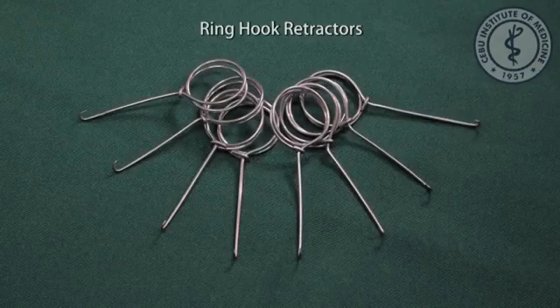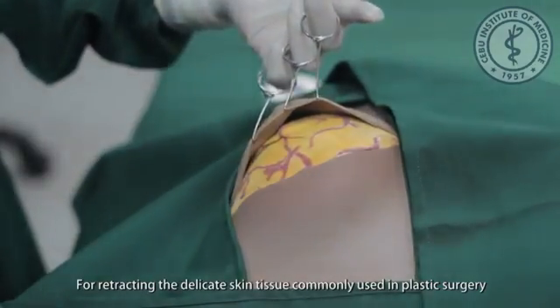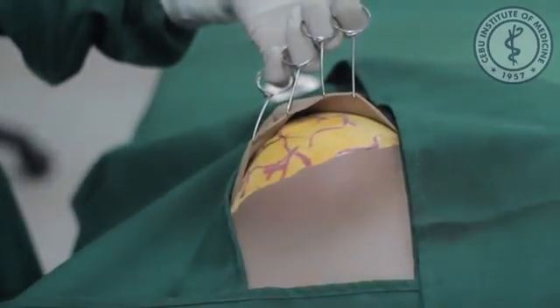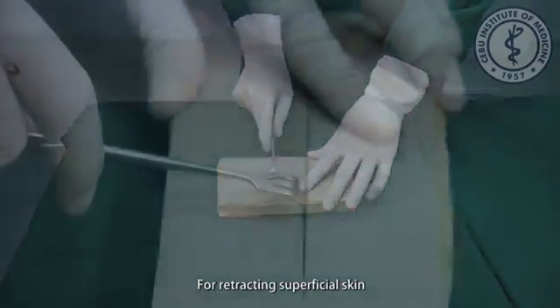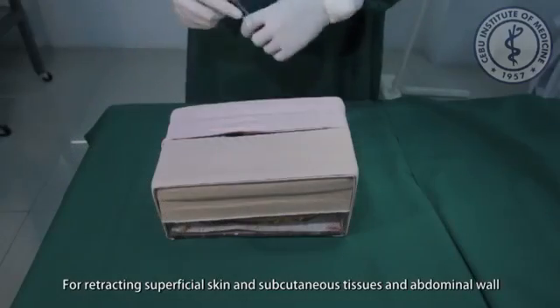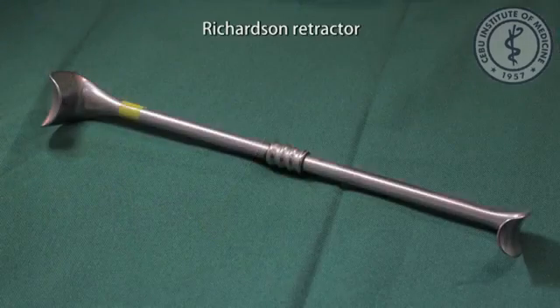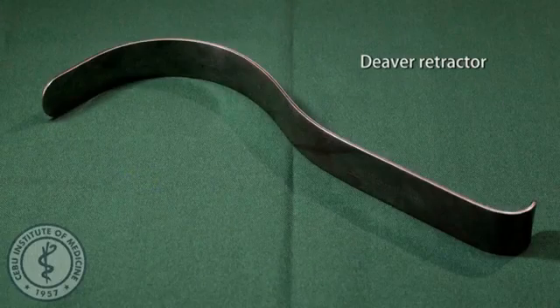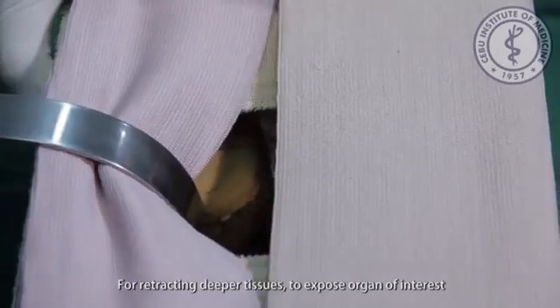Retractors. Ring hook retractors, for retracting the delicate skin tissue, commonly used in plastic surgery. Senn retractor, for retracting superficial skin. Army-Navy retractor, for retracting superficial skin and subcutaneous tissues and abdominal wall. Richardson retractor, for retracting muscle tissue. Deaver retractor, for retracting deeper tissues to expose the organ of interest.